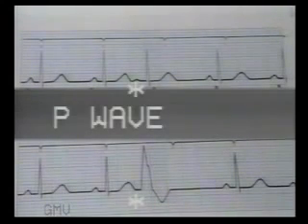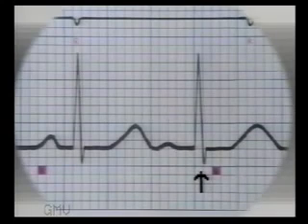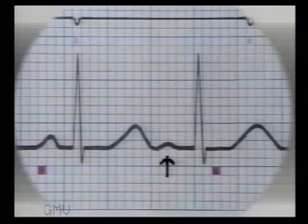Number 3. Ventricular premature beats have no P wave. A preceding P wave is seen only in supraventricular premature beats, though it may not always be visible. It may be merged with the previous T wave. When QRS complex of the premature beat has normal configuration, the beat is supraventricular. Its site of origin can be determined by studying the P wave.